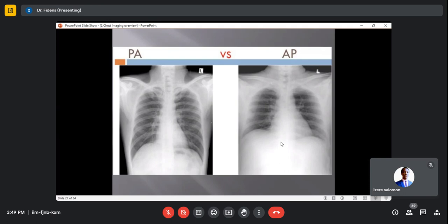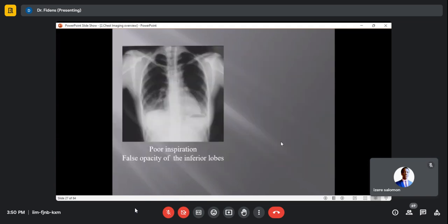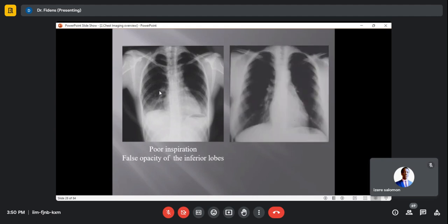Okay. What else? Is there any rotation or not? Actually, no rotation. Yeah, no rotation. Okay. Now check also these two. Compare the two and check the differences, while I do some things on my phone.